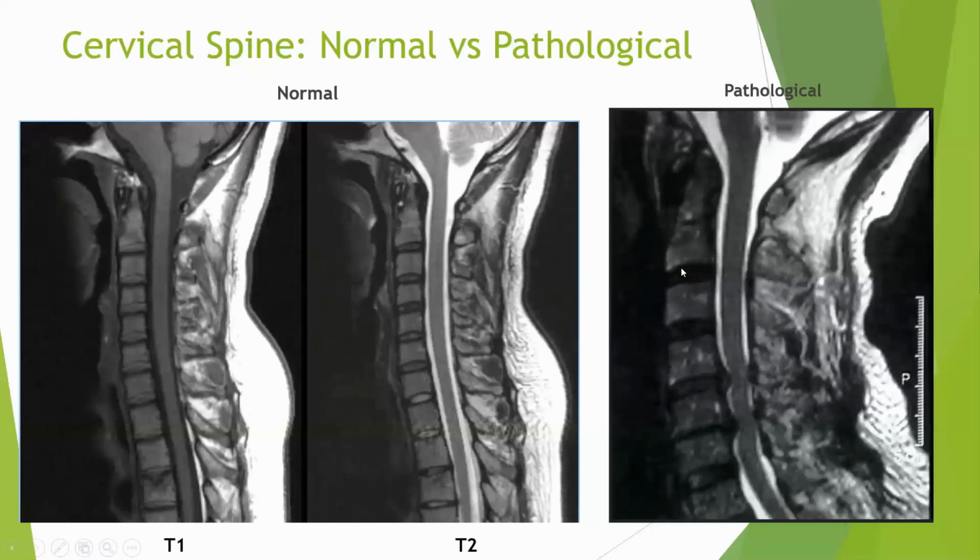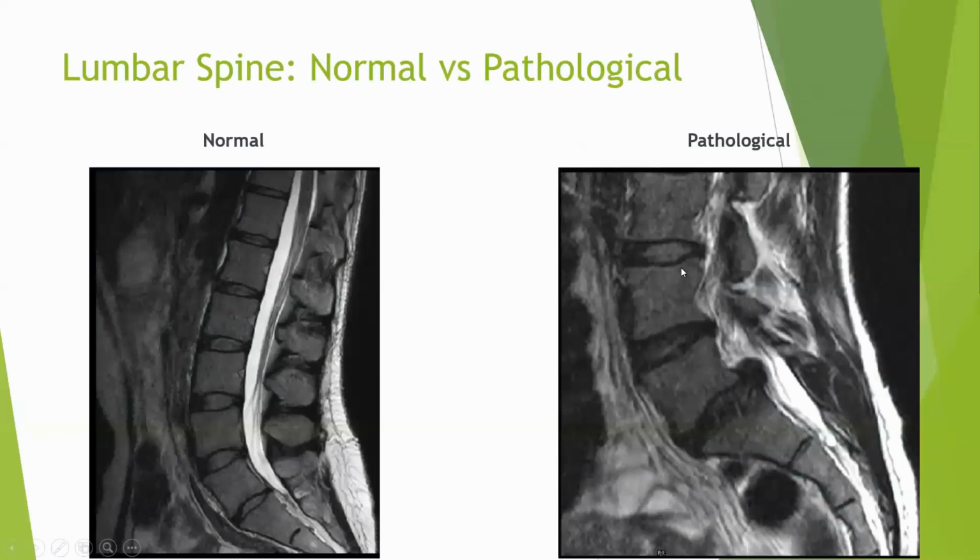And over here in the lumbar spine. Now, before we go on and discuss normal versus pathological lumbar spine, what are you noticing? These are horse's tail, nerve roots, cauda equina, because you know that actually the spinal cord ends in lumbar 2, L2 vertebrae, right?